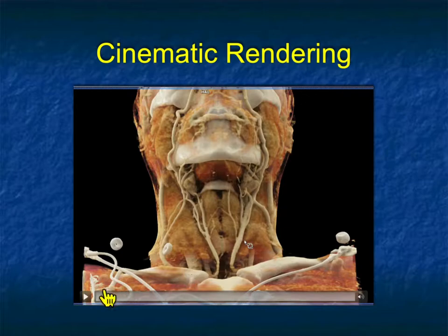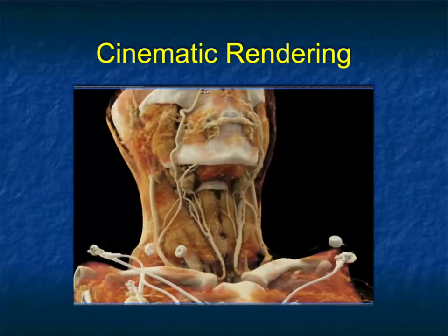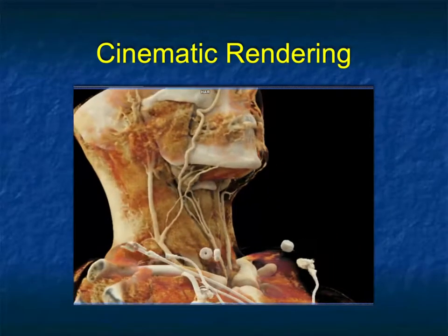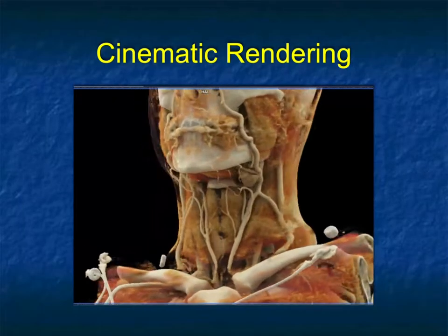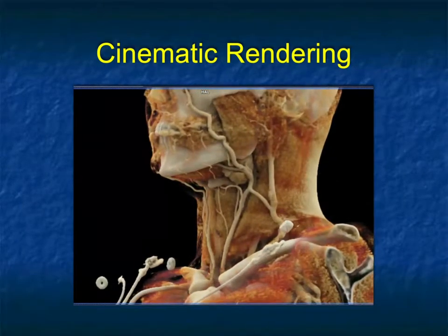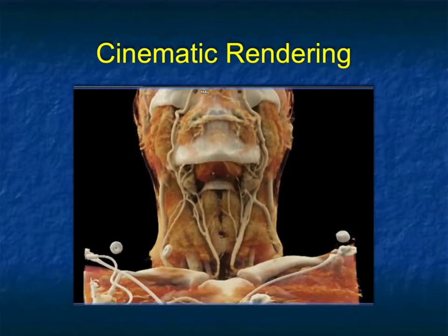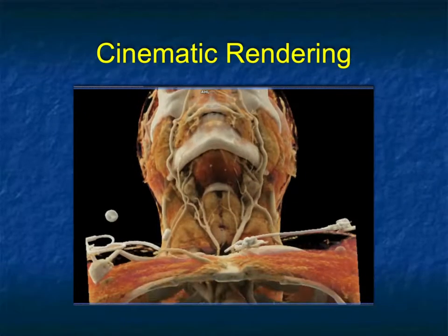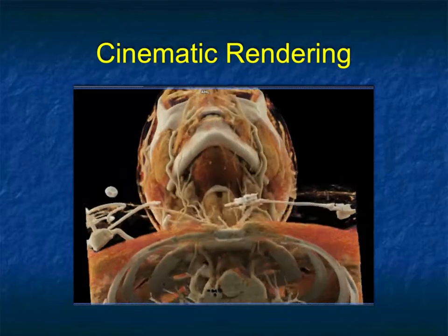And of course, if I looked at this with motion, one of the things to remember is when I show you static images, that's me taking a picture. When I'm looking at the images and I'm analyzing a study, I'm doing it in real time. I'm changing the rendering, I'm changing the position. You're doing all of this so that you can optimize whether you're looking at muscle or soft tissue or the vessels or looking in the patient's lung.